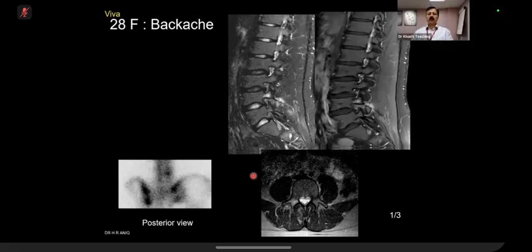So which kind of pedicle fracture again? You remember? Like a pars defect, sorry. Yes, pars defect. So please remember, just like your tibia here, the main savior for you is the CT scan. And this is another scenario in your exam where you're going to ask for a CT scan.